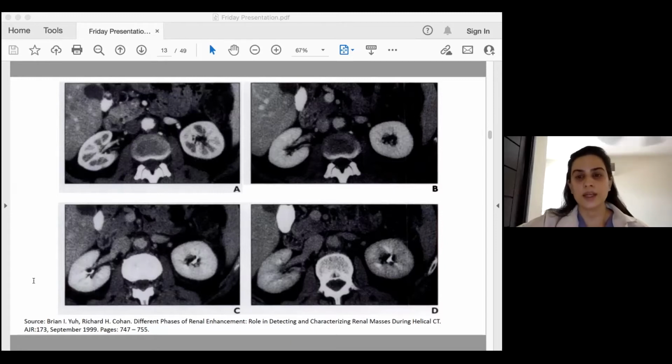Here you can see in image B that there is a somewhat uniform contrast now, the filtrate and the injection. The contrast is now entering into the medullary area. This is the early excretory phase. Even though it may seem homogeneous, you can observe here, closer to the hilum aspect, that it is actually a bit more attenuated, it's brighter. And finally, in D, you have the late excretory phase of the contrast injection, where the renal parenchyma attenuation is much less intense as compared to the previous images.